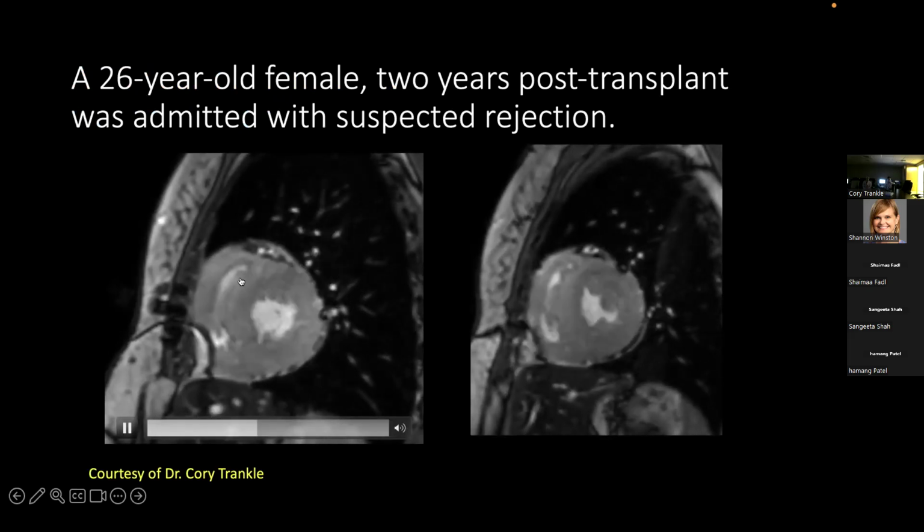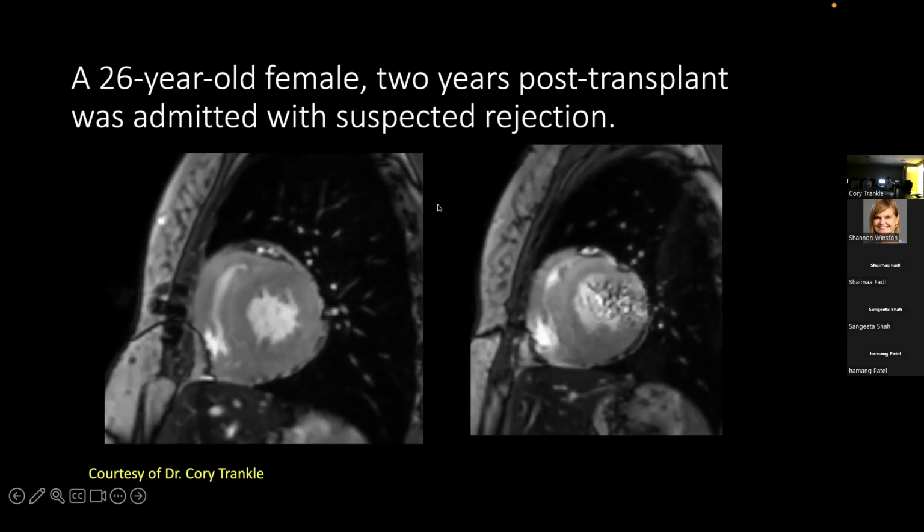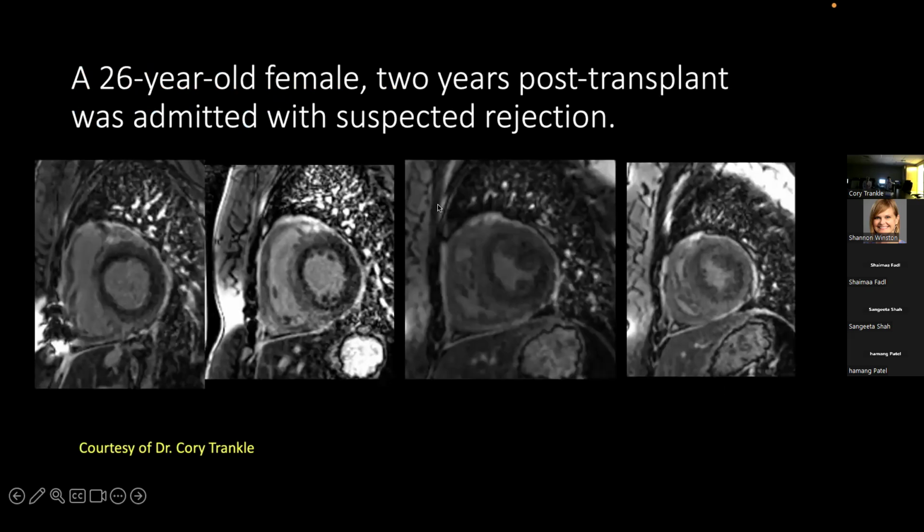There is abnormal signal, like a ring-like morphology around the epicardial and mid-myocardial regions, with a relatively dark myocardium along the inner surface of the heart. And in LGE images, there was some enhancement at the areas of the abnormal signal intensity along the anterior, septal, and inferior wall, and it is a relatively subepicardial and mid-myocardial pattern.